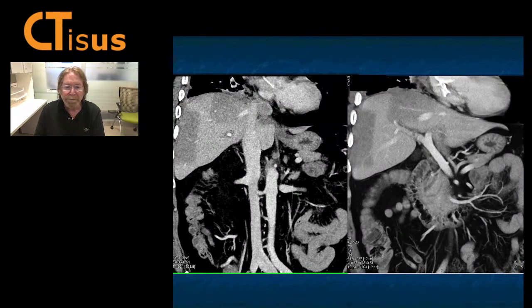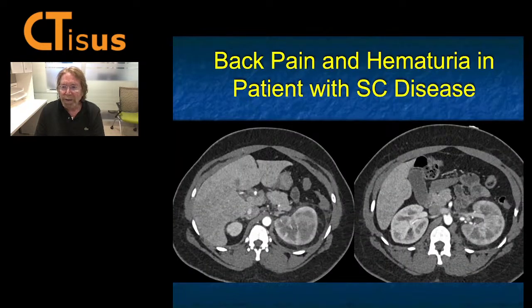What a great case. Okay, another patient with back pain, hematuria and sickle cell disease. What do we see? The left kidney is larger.